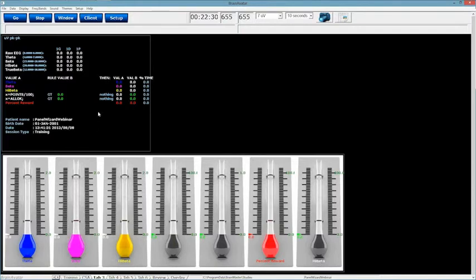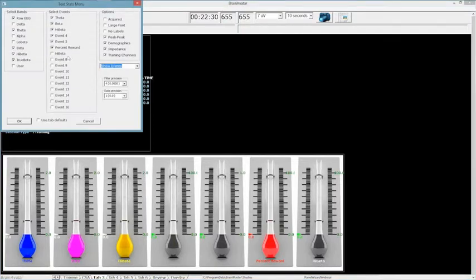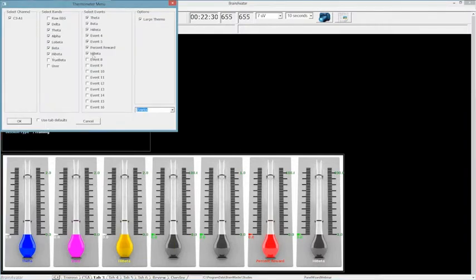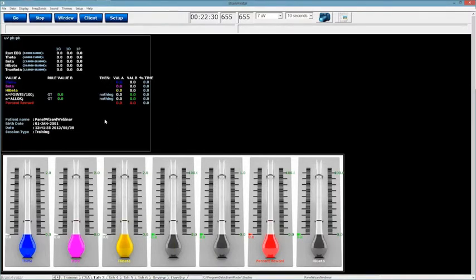The reason is because in my text stats, I clicked off all my additional events besides the first 6. In my thermometer contours, I did not. I left high beta there. So because I left event 7 open and checked, it's going to display it, whether I wanted it to or not. So that's the biggest reason that you want to do something like that.